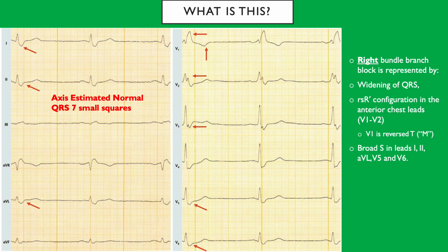Okay, good. And if you see the axis estimation, it's a normal axis, okay? Good. What about this one?